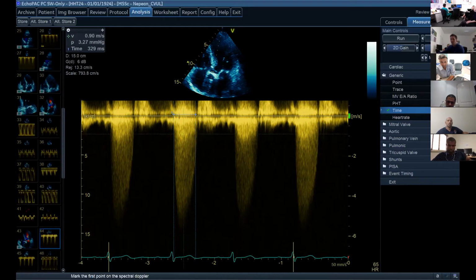This is definitely aortic because we've got the isovolumetric contraction and relaxation time. And in mitral regurg, you'd expect that to be wider, in other words. Okay? Just one thing, Sam. So there's one more trace inside of that. Is it an LVOT trace? Nice. Fantastic. And that's why this case suddenly becomes interesting.